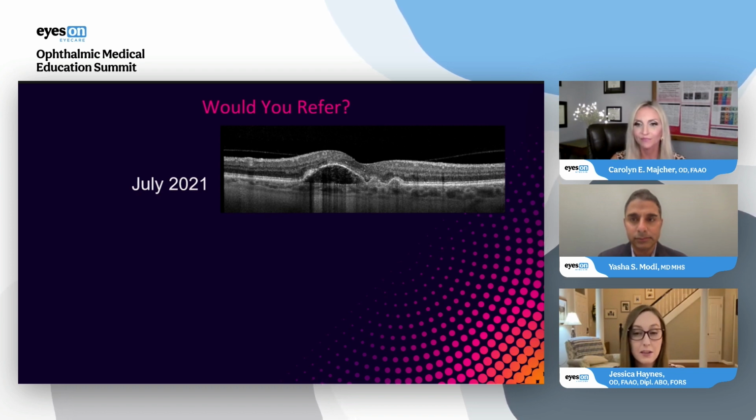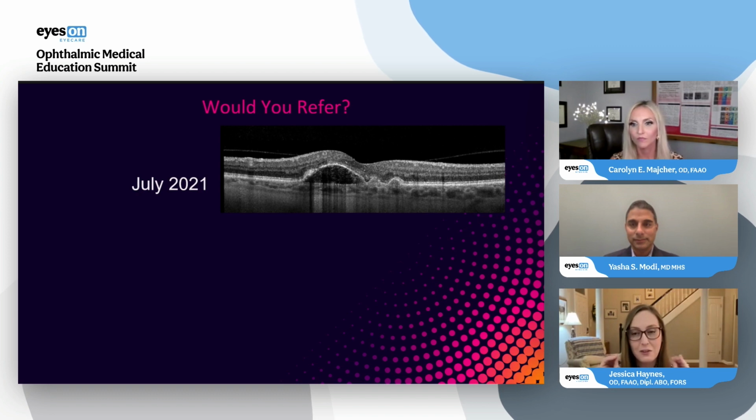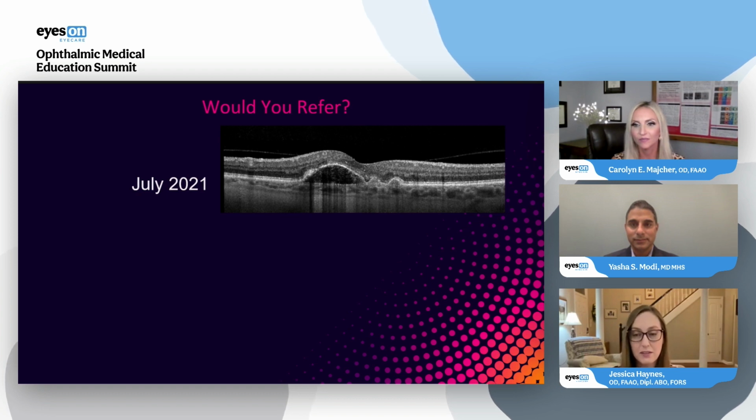As far as measuring on each individual patient, I may not do that necessarily, because now I have my mental idea of what the choroid tends to look like, but it is good practice to at least take note of the choroid, and you can use your calipers to measure it.